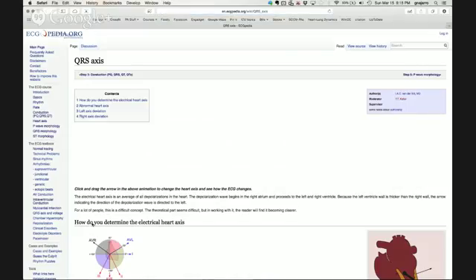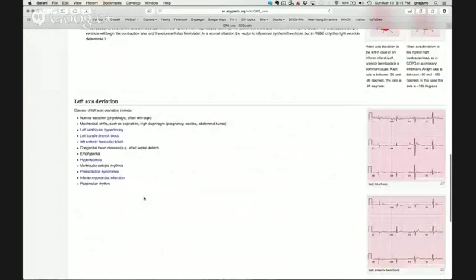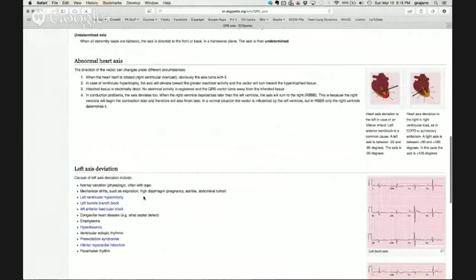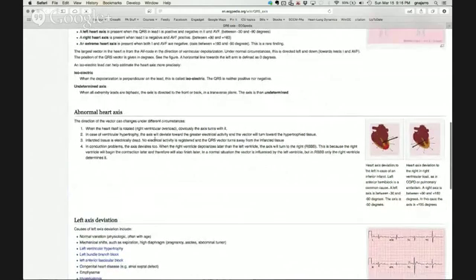Do we need to know? Far right, the differential for far right you won't need to know for right now, but the differential includes things like dextrocardia, like ventricular tachycardia, like extreme vertical heart, which is where if you have COPD lungs that are fully inflated and long and narrow, sometimes your axis can be shifted over so far over to the right, etc.